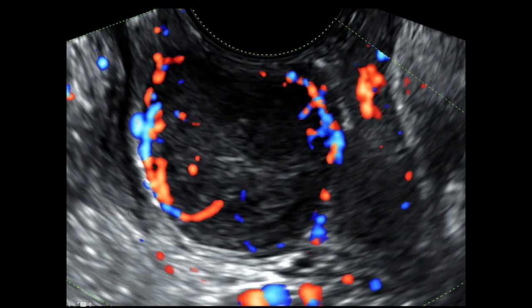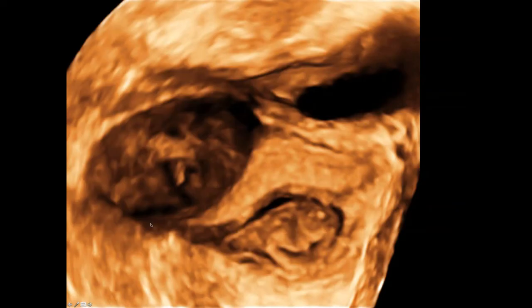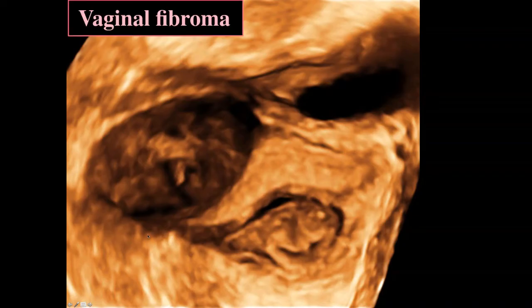The color is mostly on the outside. If you saw this in the uterus, you would think it was a fibroid. And here it is in the wall of the vagina. There's the rectum, the vagina, and part of the urethra going into the bladder. And this is, in fact, a vaginal fibroma. Fibroids can occur in the vagina separate from the uterus.